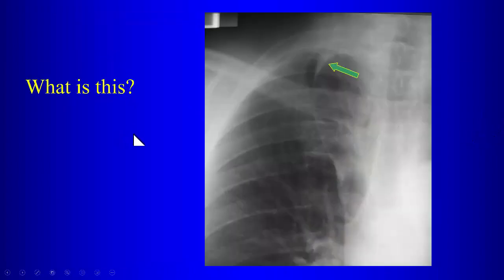What is the arrow pointing to? The trigonum parietale. Right. This patient has an azygous fissure with an azygous lobe. This down here is the azygous vein, right? So how many layers of pleura are in this? Four. They are two visceral layers and two parietal layers. So how does this occur? Why does this variant occur? Something congenital. That is correct. It's congenital.